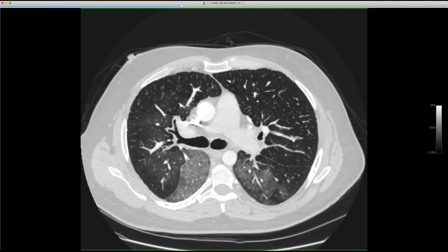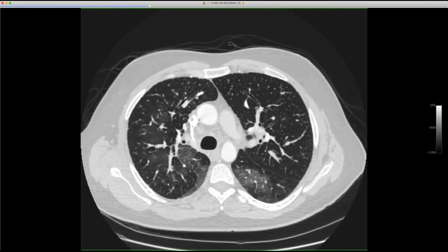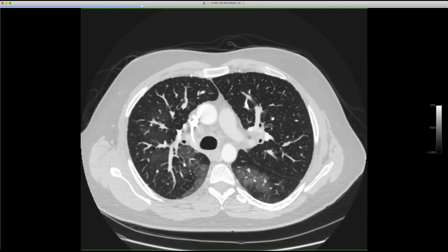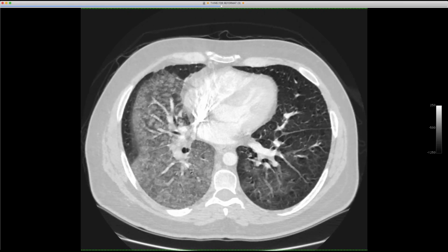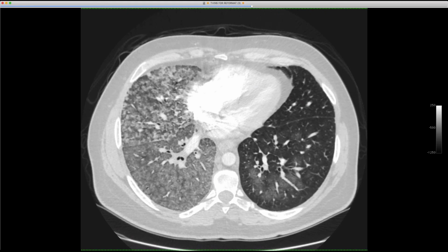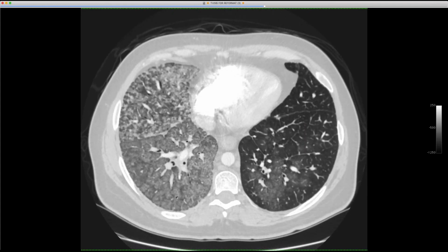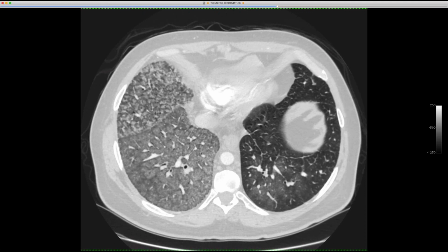So this was his CT when he presented, and you can see he's got this subpleural sort of not quite septal lines, but you can see this thickening right where the interlobular septa would plug into the pleura. And he's got irregularity along the fissure and the veins and the bronchovascular bundles. And then he's got this very interesting pattern. I would almost call them acinar type nodules to invoke an older term, but it's almost the whole lobules involved, but they're sparing on the periphery. So there's a lobular filling process with a little bit of septal thickening.